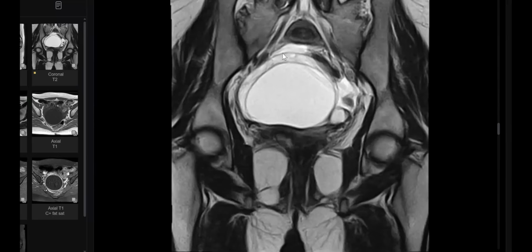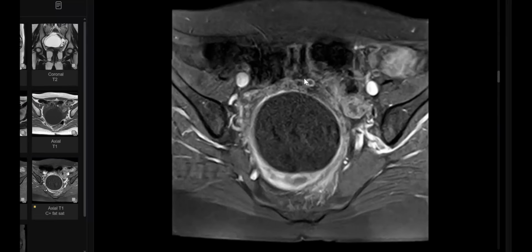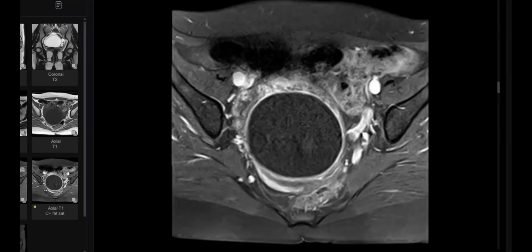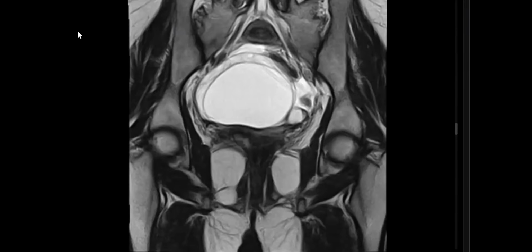Ovarian edema is the most sensitive sign if the ovary doesn't contain any mass. Another sign, abnormal location, is also important, but the ovary still can be saved. We have some heterogeneous enhancement, so it still can be saved, and no heterogeneity in the residual stroma. So in case of an ovary containing a mass or cyst, look for any edema and location.